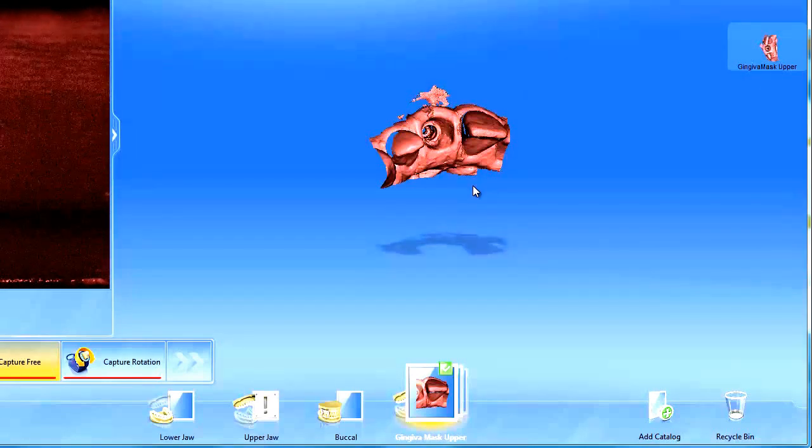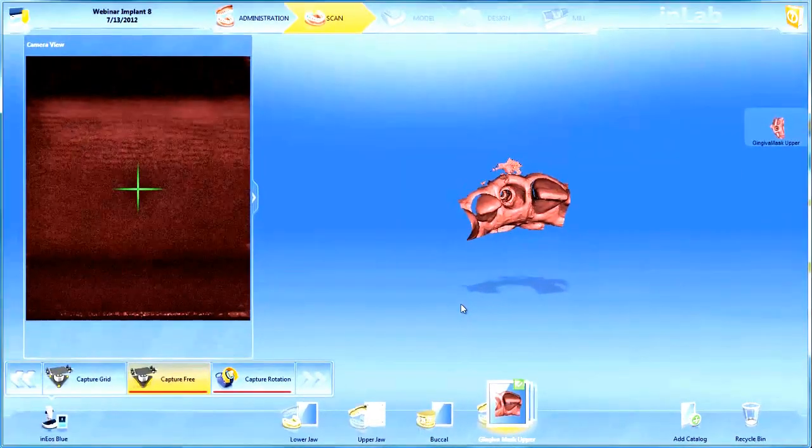Because as you know, and everybody that does implants knows, if it's not seated correctly, everything beyond that point is wrong. So nothing's going to fit right. So it's critical that we're able to see that that implant is down. Consequently, that's why we use the soft tissue model. Remove it so we can look and see. That's why we have another catalog.